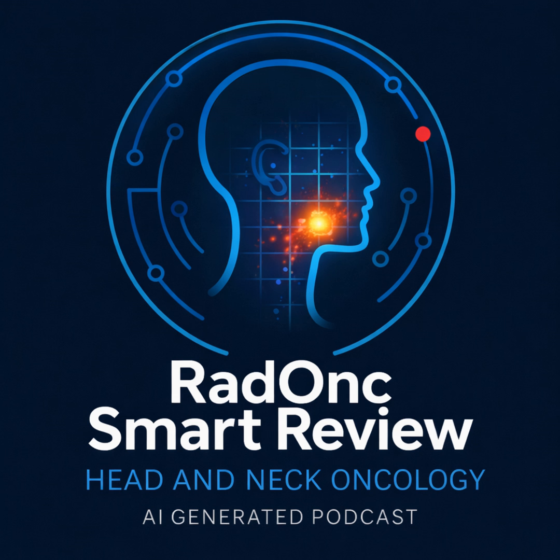He has the trifecta. Any one of these would trigger stoma coverage. He has all 3. So I am contouring the stoma site as a structure. My target is 60 gray to the surface. How do you achieve 60 gray to the skin surface? Usually we spare the skin.